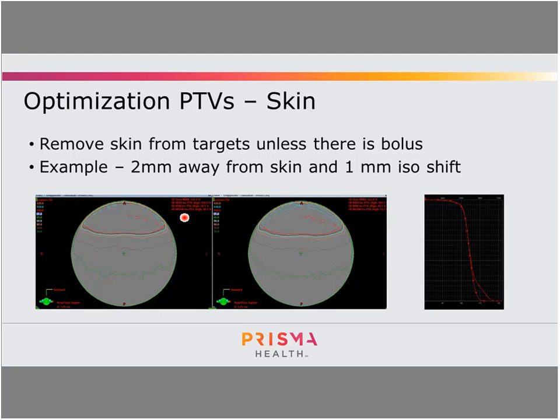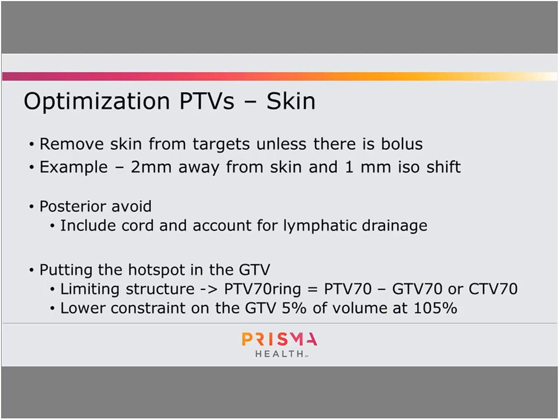So if you're ever worried about treating the skin inverse planned, you can use that tool and see how realistic that is. Because you can imagine if this was a prostate and you move it a millimeter, you're not really going to see much of a difference. So that's kind of the idea there. So use bolus, very important, or subtract about 5 millimeters from the skin.